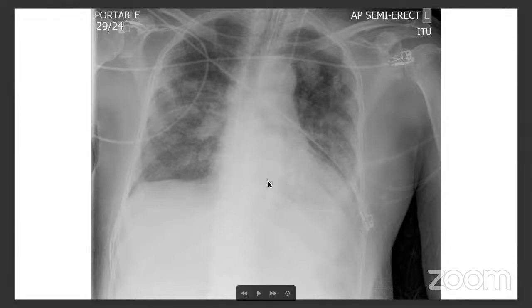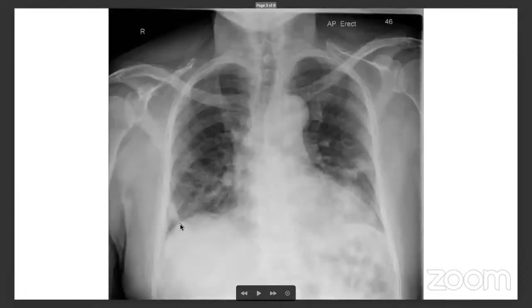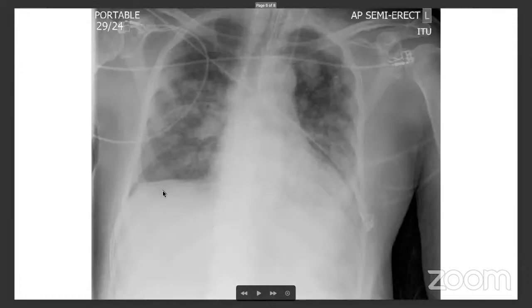So in this X-ray, I'll just show one subtle finding, which may be useful. As you can see, in the first X-ray, just look at the diaphragmatic margin here. The way the diaphragm dome goes, the apex of a normal diaphragm is in the midline. That's how the normal diaphragm will be in any patient. In this X-ray you can see it's a bit flattened, and the apex has gone laterally. That is a sign of subpulmonic effusion, when you have fluid under the lung.